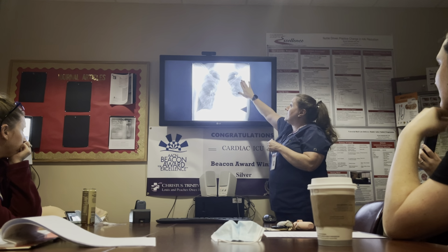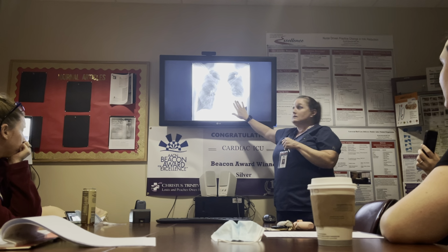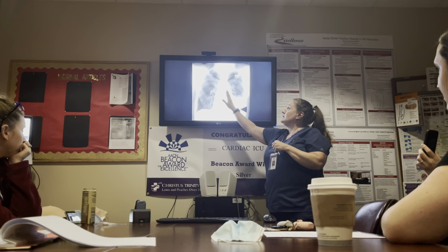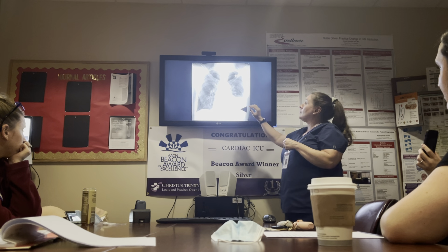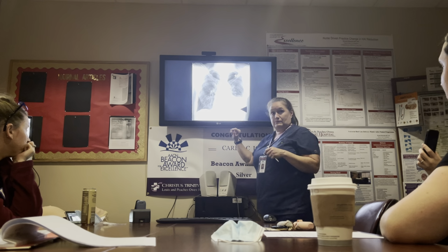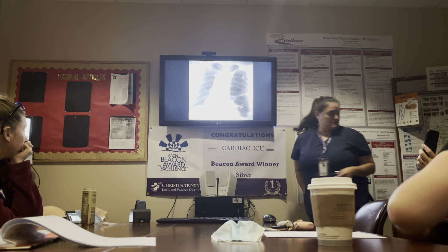So this is a pneumothorax, but this is also fluid in here from that. So, and they've got some free air, right, pneumomediastinum right there as well. So this probably needs a chest tube to evacuate. There's their stomach bubble there, okay? All right, what's this?